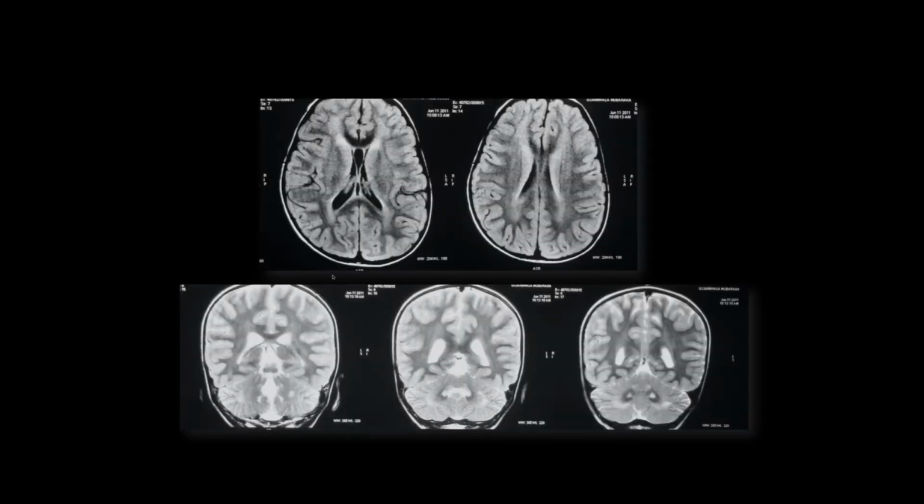So at this stage, I'll probably take over with the MRI findings. And we have the FLAIR images on top. The axial FLAIR images again demonstrate these periventricular hyperintensities with relative sparing of the subcortical regions. And on the coronal T2s in the posterior fossa, again, you can appreciate the similar posterior fossa findings as seen in the case from Dr. Boltshauser. Again, there is hyperintensity of the hilus. The dentate nucleus itself is slightly dark. Cerebellar white matter again demonstrates these high signal changes.